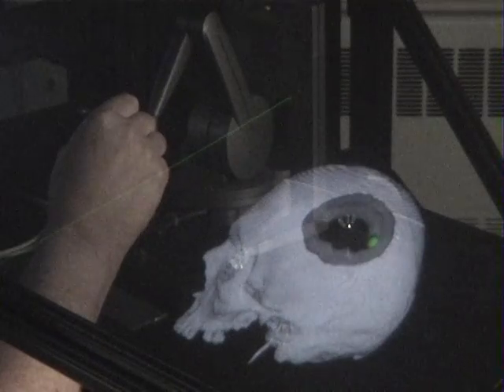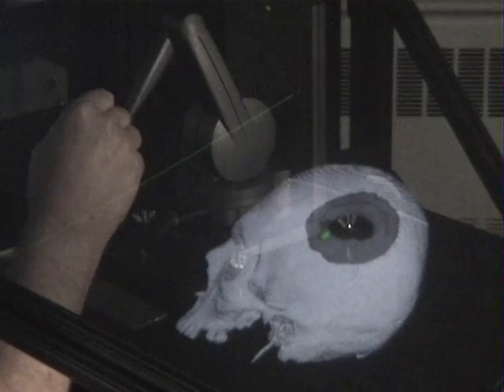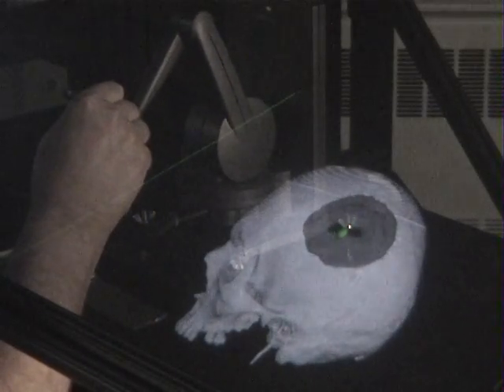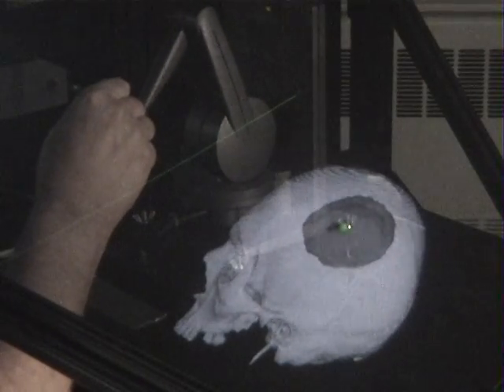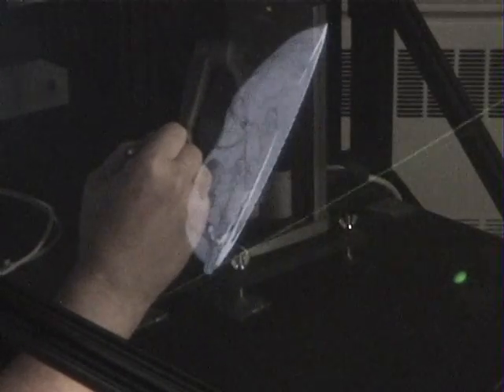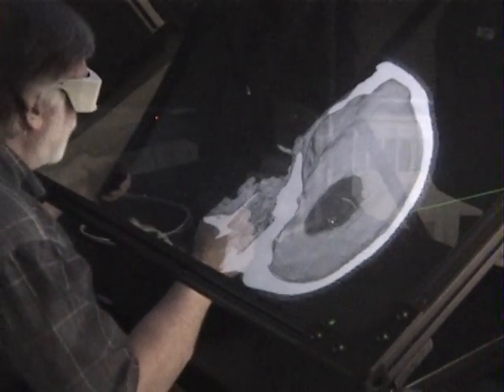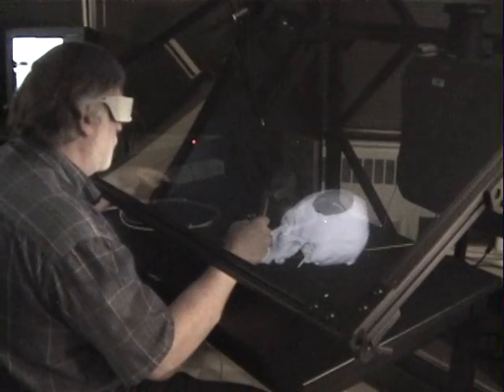And as you can see, I can add multiple layers and essentially fill in the void very quickly with a workable volume. Now I can turn the model after I've covered the outside just to make sure I have sufficient volume on the inside, and it looks fine for purposes of our demonstration.